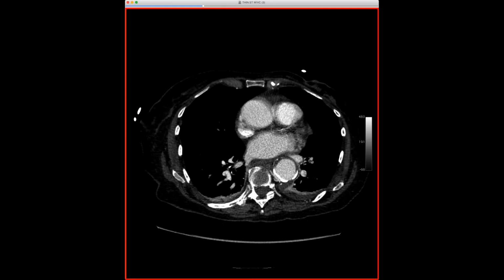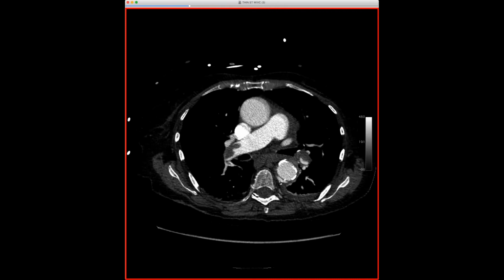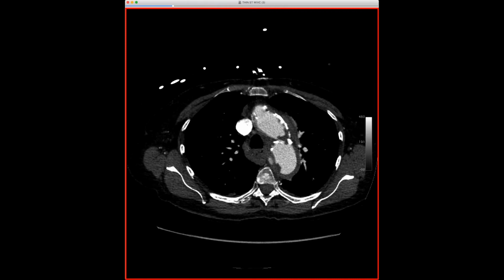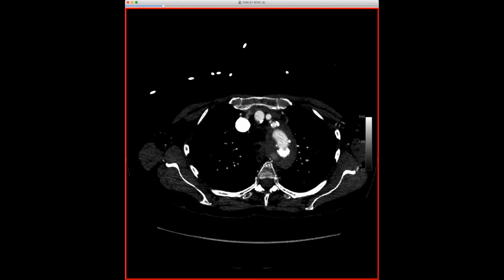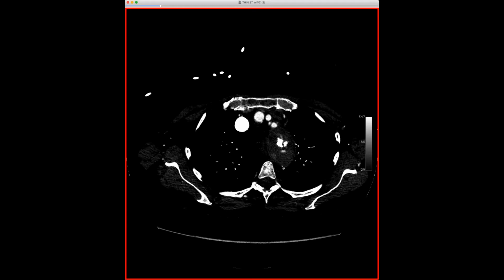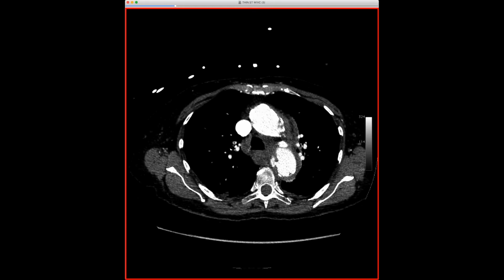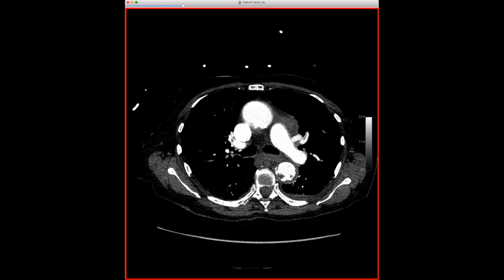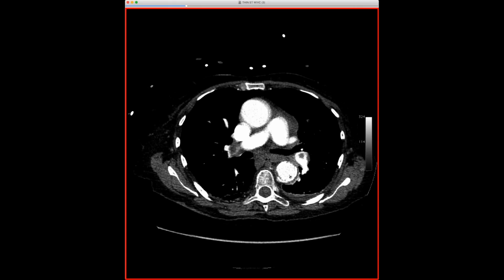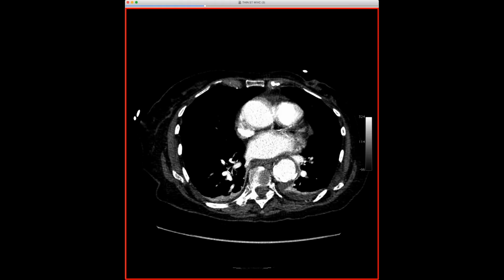But Jeff, can you take us back to the aortic arch? Was there any filling of the cuff around the calcification in the arch? Right up here. Huh. Not much. But my theory is it probably ruptured right in here, where this plaque is, and it just kind of tracks along in there. And then why she threw pulmonary emboli at the same time, I have no clue. I can't explain that.